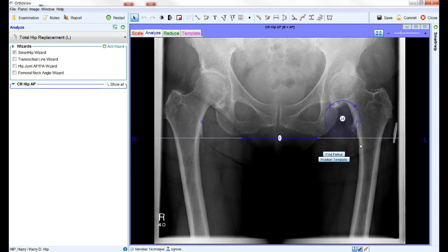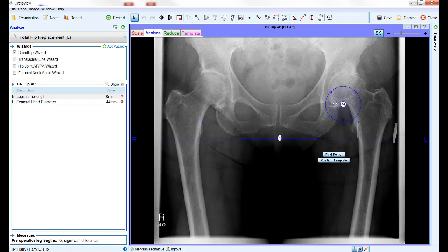To move and reposition these and all other wizards, place the mouse anywhere on the general outline or inside the shape of the wizard. This allows you to left click and drag the whole piece. Placing the mouse on one of the small squares and left clicking allows you to drag the individual points.